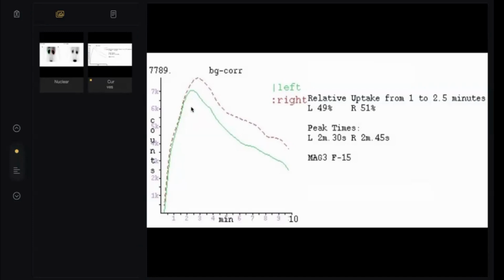Okay. But generally, one peak is about 7K counts, and the other one is 8K. Like two different rich men: one has three big companies and one has only two. Not poor like us. See here, the left kidney split function is 49, the right one is 51.